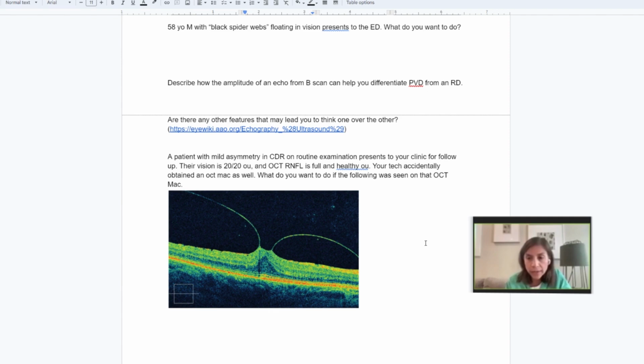All right. So if you see the hyaloid, that's the hyaloid that's attached right at the fovea there. We call this vitreomacular traction. When it's pulling up on the fovea and distorting the foveal contour, you call that vitreomacular traction. If you just see that it's adherent to the fovea, but it's not pulling and you still see a good foveal contour, that would be vitreomacular adhesion.